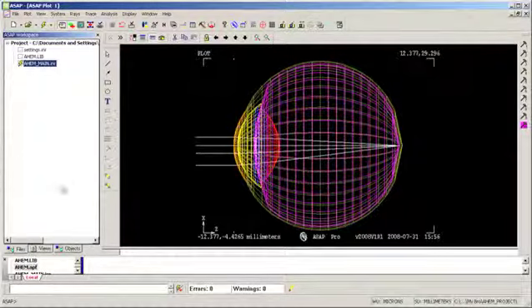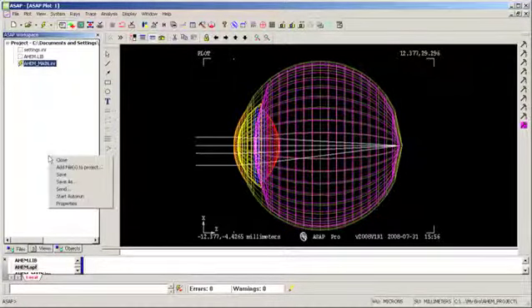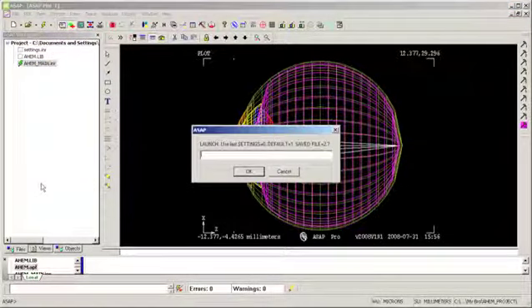It's very simple to start AHEM. We right-click in our workspace and start Auto Run, and we get a prompt screen. It's a launch screen, and it asks us three questions: settings, default, or saved file. Right now I'm going to run the default model, but I do have the options for reloading settings that were generated before, if you've been working on an eye model and you just want to reload it, and also if you have a saved file from some previous session that you want to load.